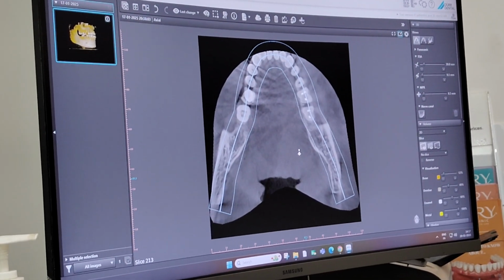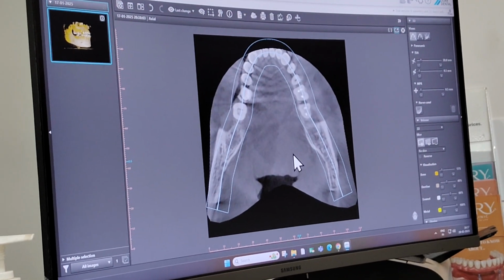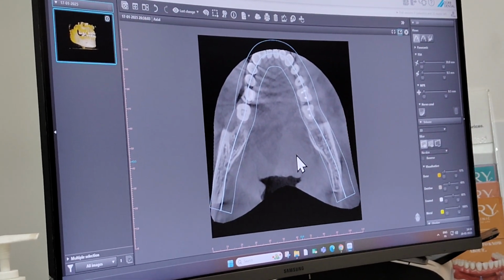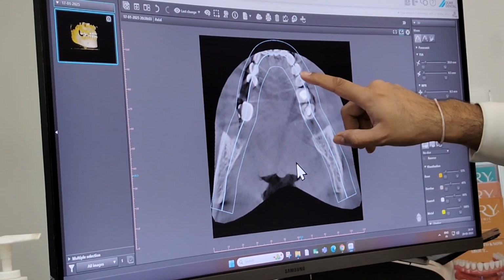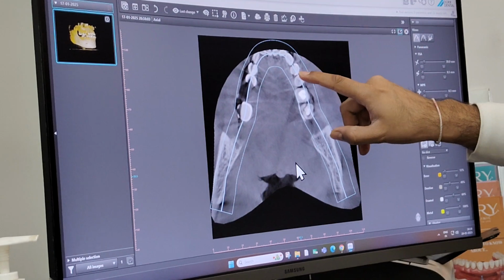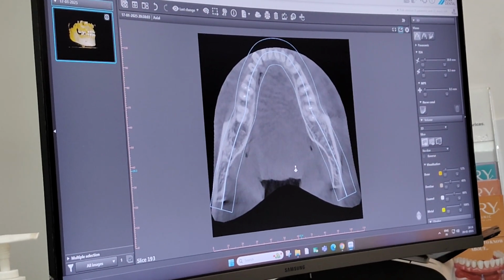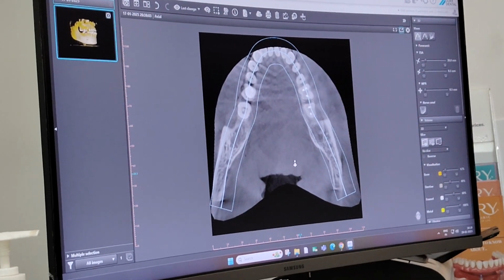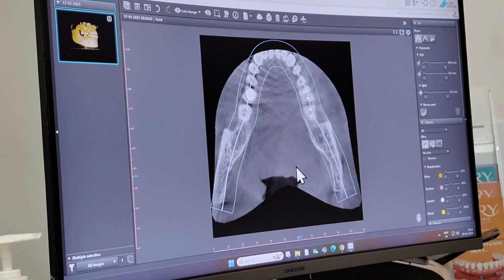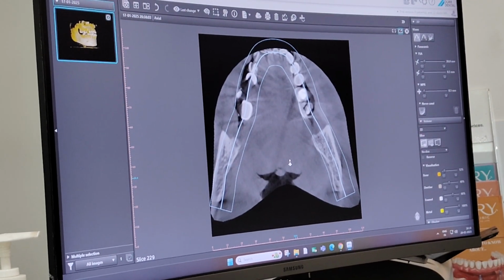Now this is the point of the CEJ of the tooth, where you are able to see all the orifices properly. Apices was the base and orifice is the coronal portion. This is the CEJ. Now you start to appreciate the enamel border. Can you see this? This was not present in the lower slices. But when you come a little more up, you can see more whitish area. Then you move up, so you see the crown portion.